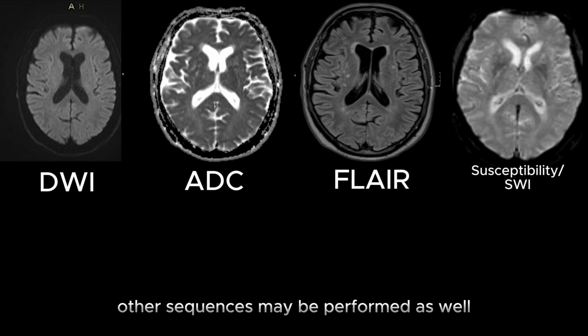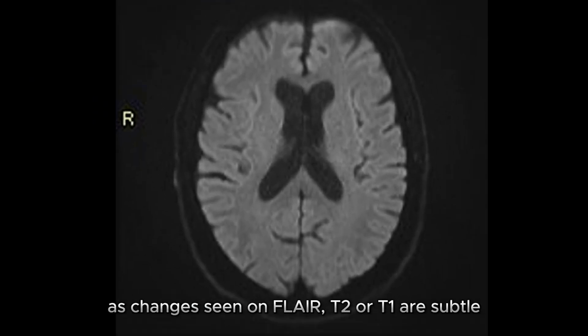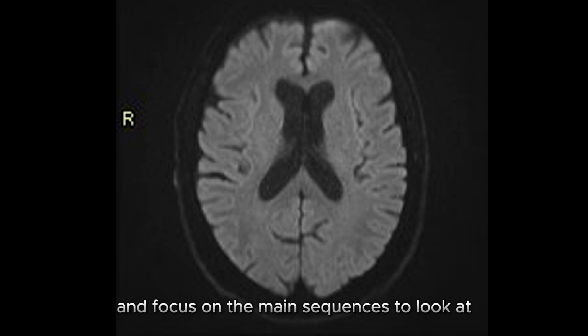Other sequences may be performed as well, such as T1 and T2. The best sequence on MRI to pick up early ischemic change is diffusion-weighted imaging, as changes seen on FLAIR, T2, or T1 are subtle and even not apparent in the first few hours after onset. To keep this video short and simple, we are not going to dive into any MRI physics and will focus on the main sequences to look at.